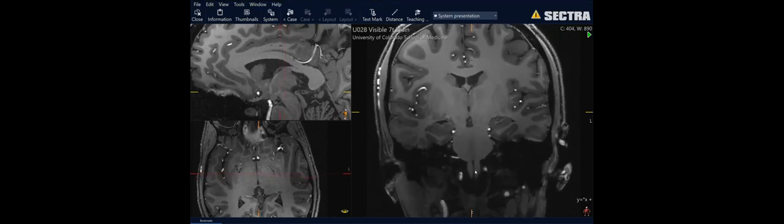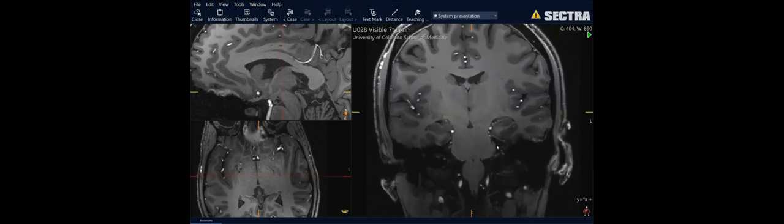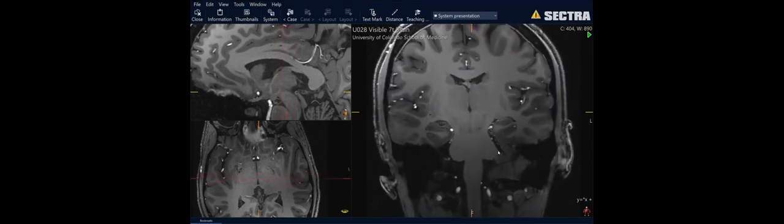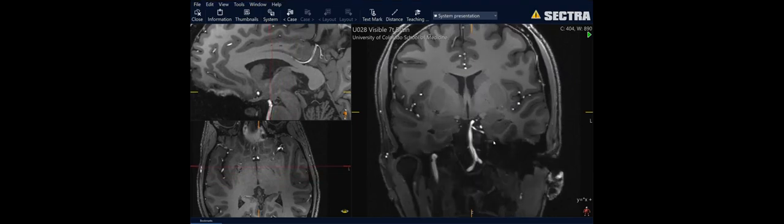And then as we make our way more anteriorly, the only structures we're going to see in the medulla are those pyramids, medullary pyramids with that midline anteromedian sulcus or fissure. And also make out somewhat the trigeminal nerve. So as we come anteriorly, this structure here is the trigeminal nerve.